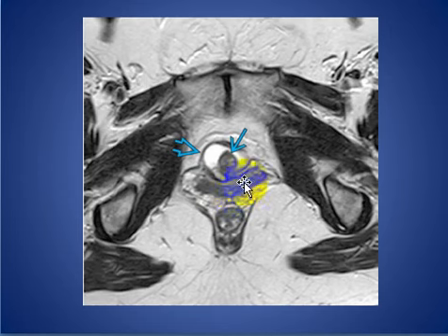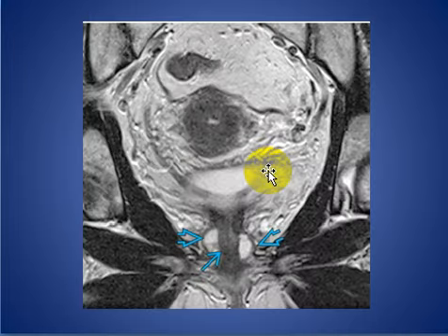Here we see this is the vagina, and this is the urethra, and this is the cyst. This is the urethral diverticulum on axial T2 weighted images, and it presents as a horseshoe-shaped T2 high signal intensity lesion surrounding the urethra. Horseshoe shape, more prominent on the right side. The urethral diverticulum on this coronal T2 weighted image shows high signal intensity on both sides of the urethra.